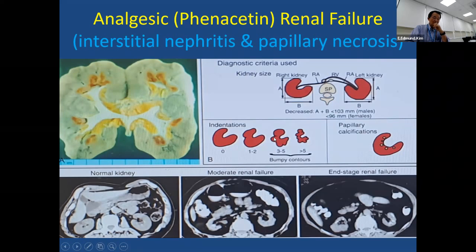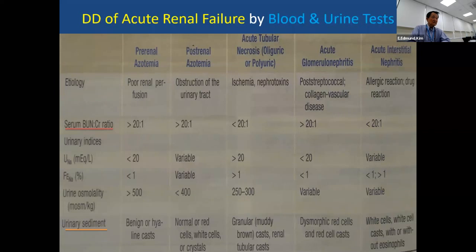So we can evaluate that a tumor cannot take up DMSA. Yeah, so only normally functioning renal parenchymal cortical tissue takes up and retains DMSA in the tubules. So that's what's shown, and then some papillary calcification. You can see calcifications in the papillary necrosis.